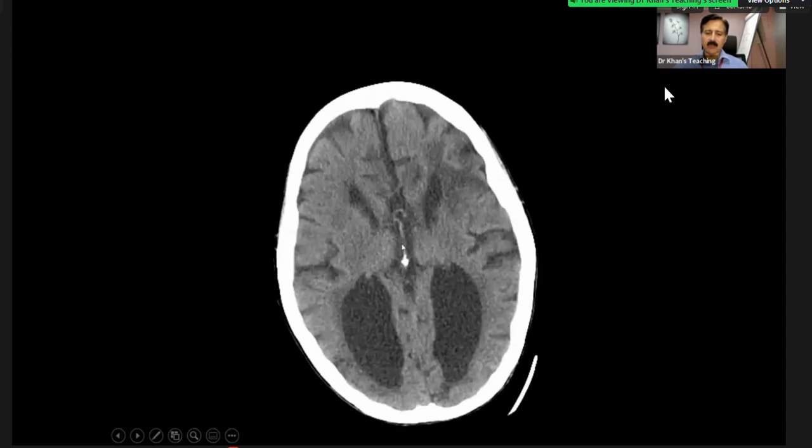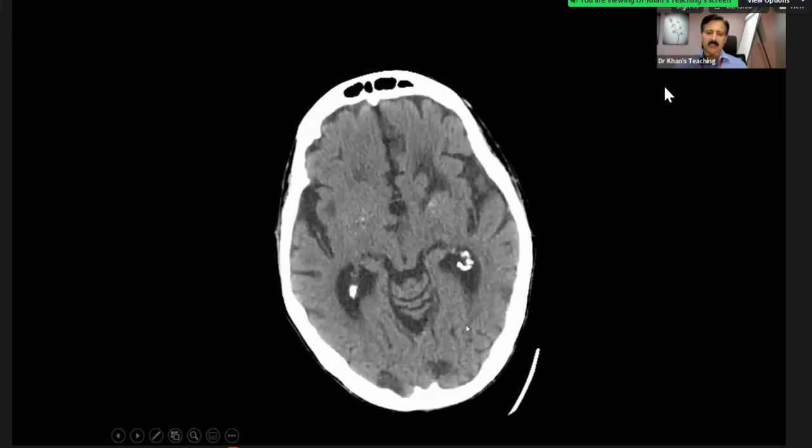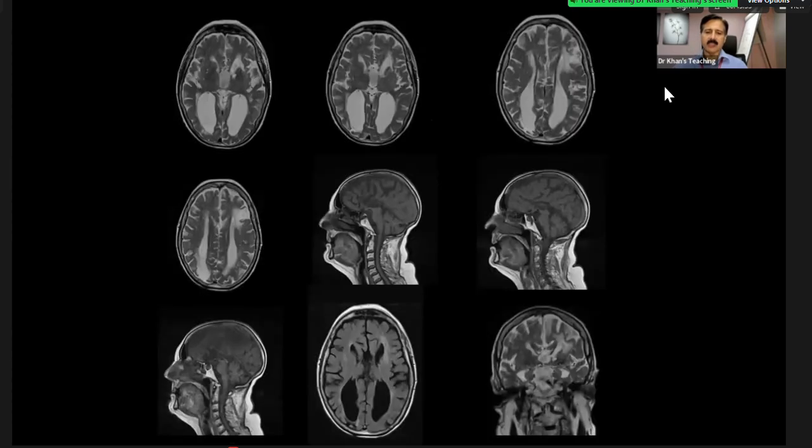You come back down, the third ventricle has gone up. And look at this colpocephaly, which can happen in corpus callosum agenesis. And this is a 73-year-old. If you see the MR, there was a bit of, I should use the word dysgenesis, because anteriorly it is atrophic, but it is there. The main thing to learn is that they will show you in an axial slice in the exam, axial CT or an axial MR.